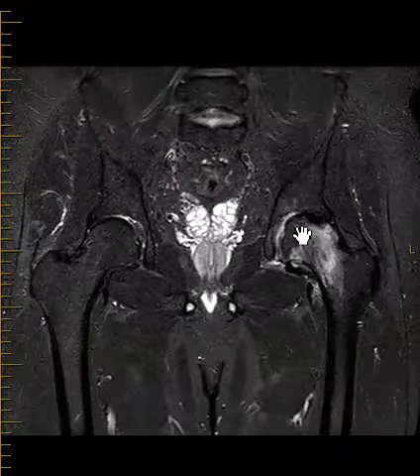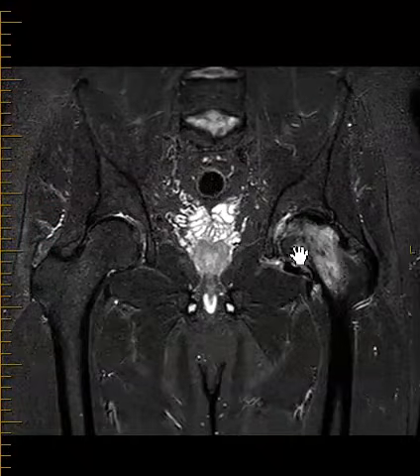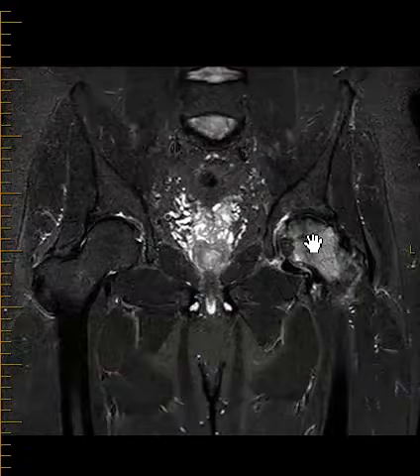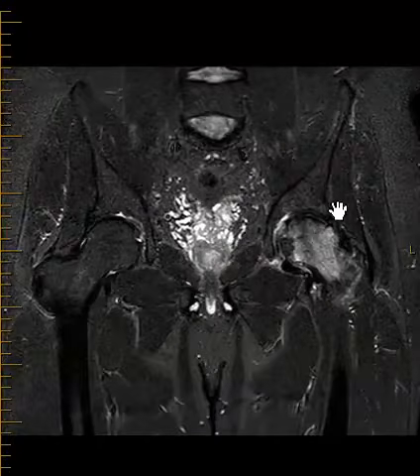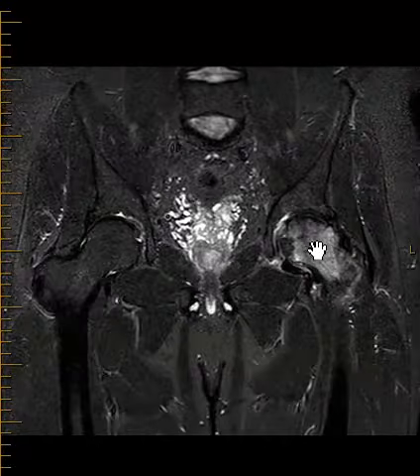So this is one of probably three things. Number one is avascular necrosis or osteonecrosis, where the bone infarcts and they get prominent marrow edema and eventually the femoral head might collapse. You can have something called migratory osteoporosis, a self-limited thing where you get intense marrow edema and pain and it can migrate to other parts. You can have stress injuries, stress fractures can cause patterns of marrow edema not dissimilar to this.